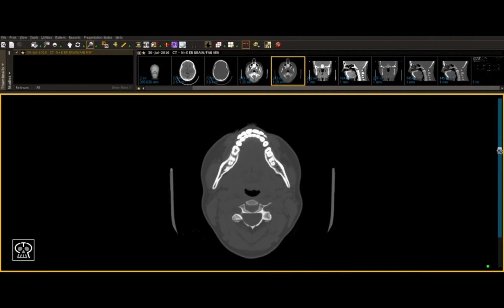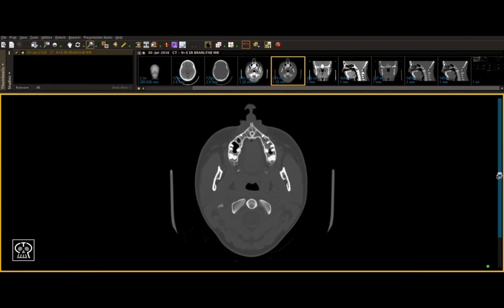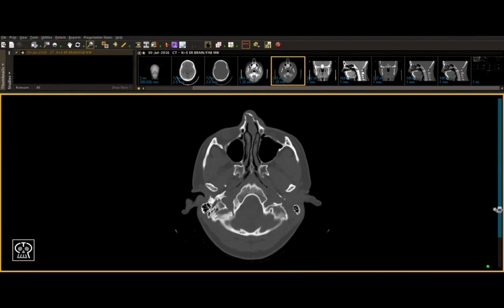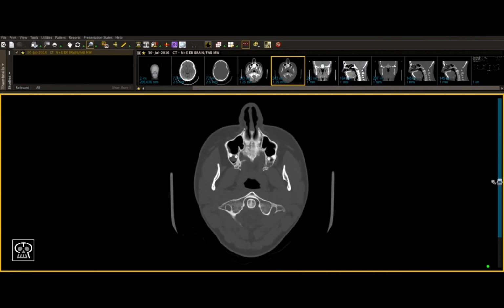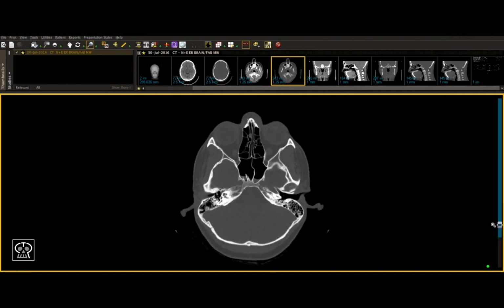So scrolling through, we're going through the body towards the angle area, going up the ascending ramus, we see our lingula and inferior alveolar nerve entering there. Keep scrolling up, we see the sigmoid notch separating the coronoid. Go back down to the sigmoid notch, go up to the condyle, and view the entire condyle, making sure there's no fractures.